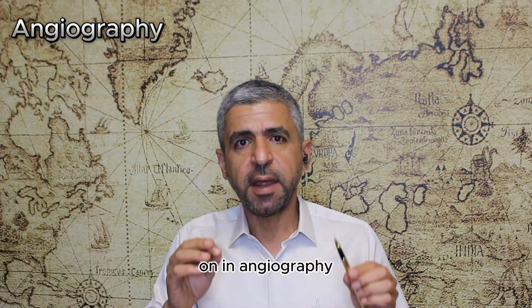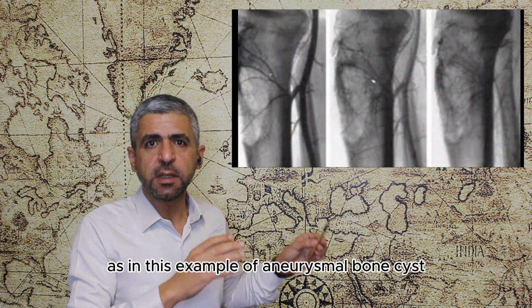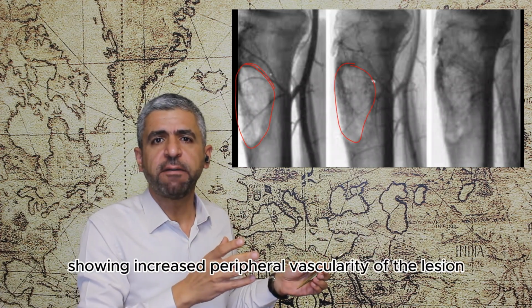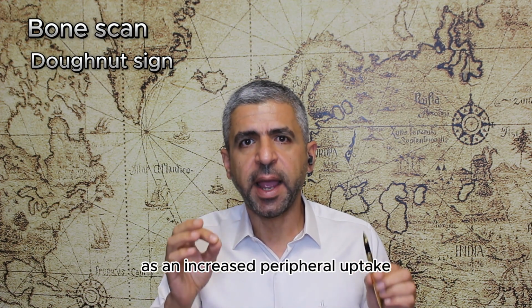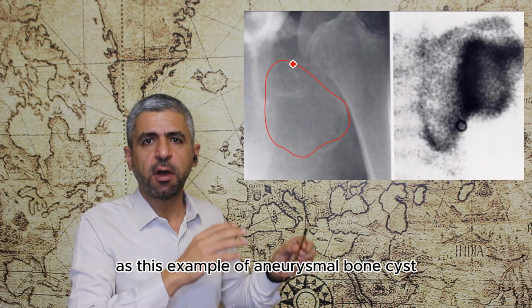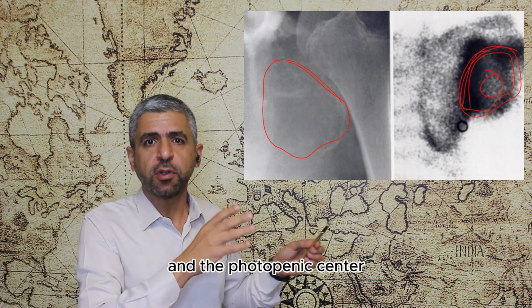On angiography, the ABC will show hypervascularity at the periphery, as in this example of aneurysmal bone cyst involving the tibia, showing increased peripheral vascularity of the lesion on this digital subtraction angiography. On bone scan, we will see what's called donut sign, as an increased peripheral uptake and a photopenic center. As in this example of aneurysmal bone cyst of the scapula, we can clearly see the donut sign as an increased peripheral uptake and a photopenic center.